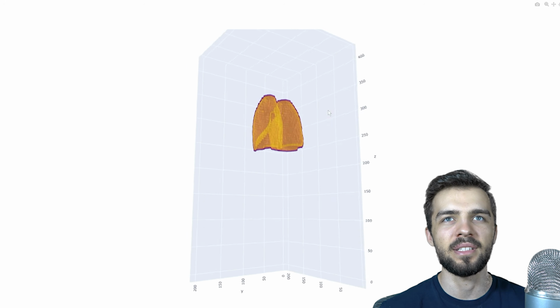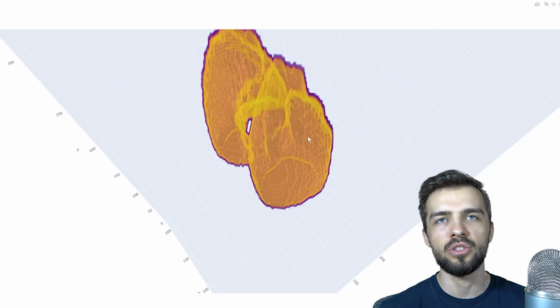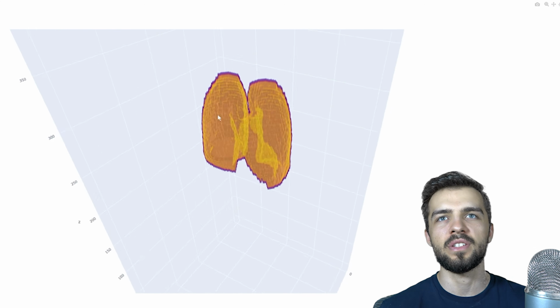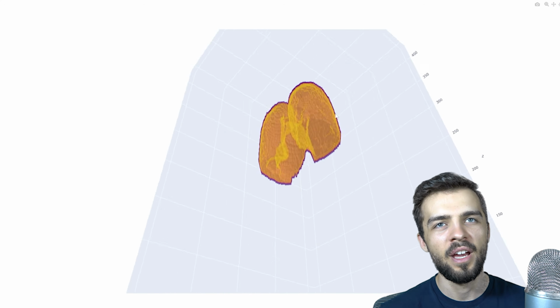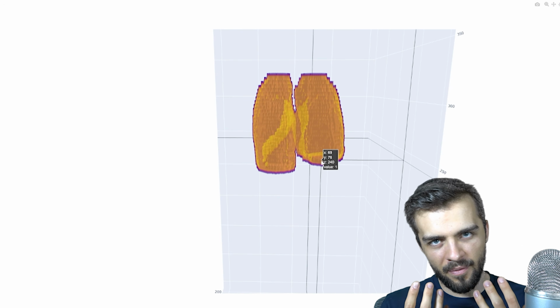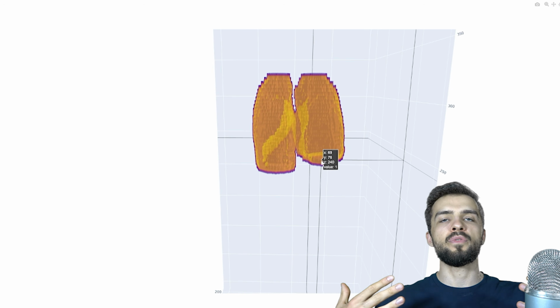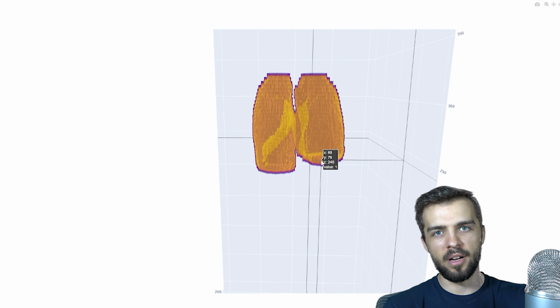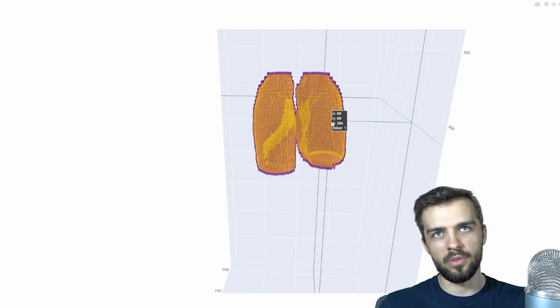But I opened up this interactive HTML from Plotly, and as you can see, we have the two lungs segmented beautifully. Of course, the main purpose of this video wasn't quite the visualization at the end. This is more just a tool for me to show you all the slices at once. But the idea is that once you have a mask of a region of interest, it could be a lung, for example, in a scan, it could be the heart, it could be any picture where maybe you have a car and you want to segment the car. You can do things with those masks, right?